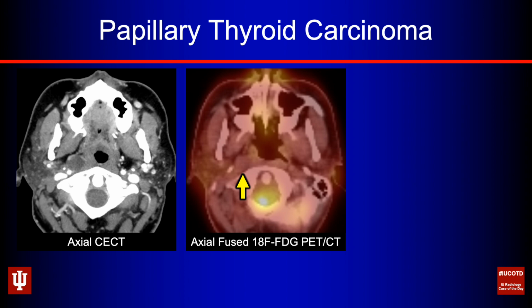That's absolutely wrong. This is one of the critical things to recognize about cystic or necrotic lymph nodes. They are still metastatic lymph nodes, but in order to have FDG uptake, you have to have at least a base level of solid tumor component within it. And when something gets very cystic or very necrotic, it can drive down that FDG signal. So when you see that, it does need to get biopsied.